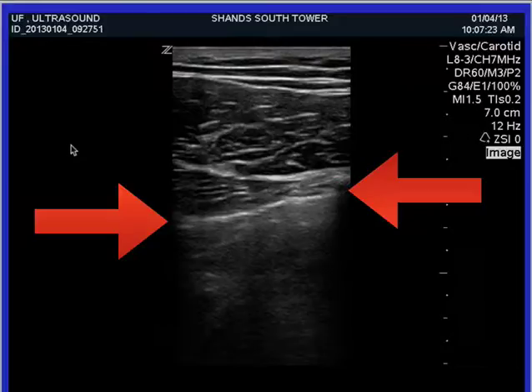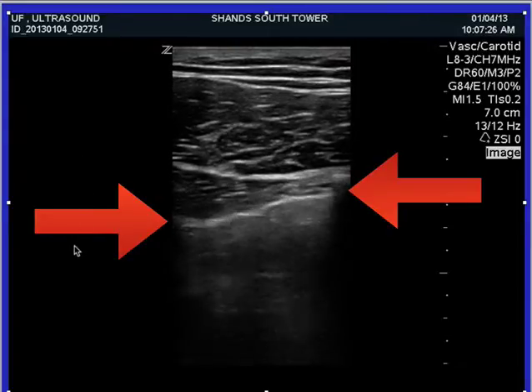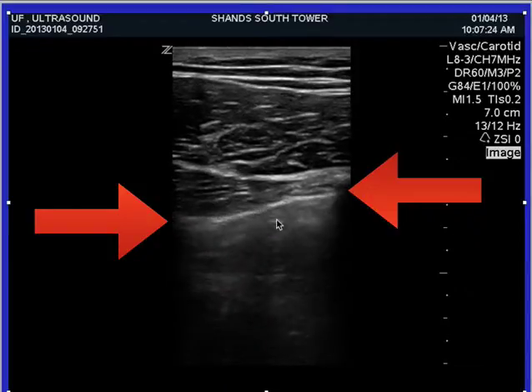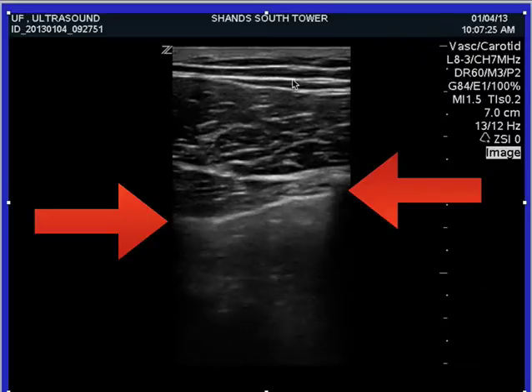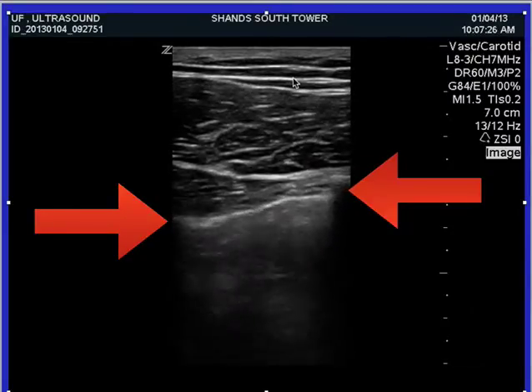So here is something similar to when I had the lecture on basic lung ultrasound. Essentially this shows lung sliding. This is very important for you to be able to acknowledge that you can see the lung sliding here. You can compare it even to up here, where if you look at this hyperechoic line, you don't see any sliding at all.